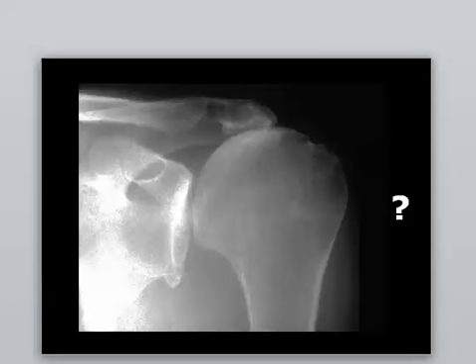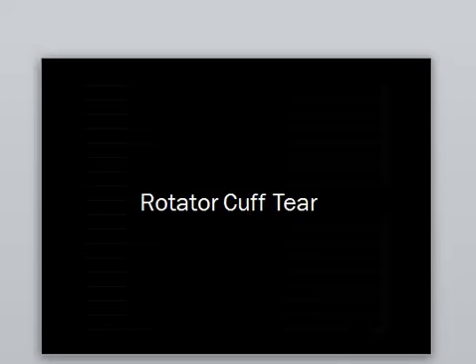What do you expect here? This one is subluxated, and there is definite irregularities here and there. If you look at this, the greater tuberosity is irregular, the glenoid inferiorly is irregular, so you should suspect that the rotator cuff is disrupted. There is something wrong. So once you see subluxation, glenoid abnormality, or greater tuberosity abnormality, please think of rotator cuff tear.